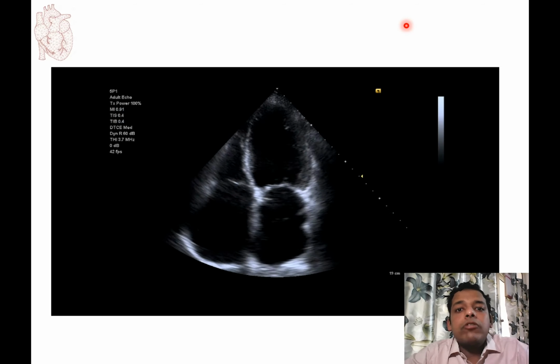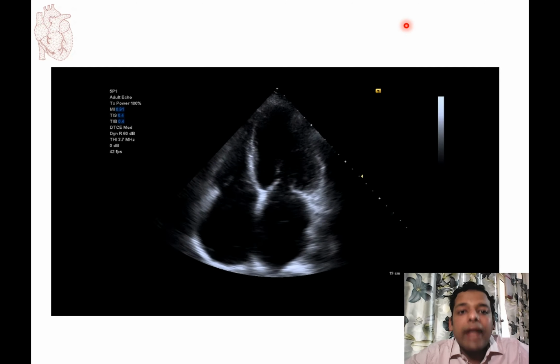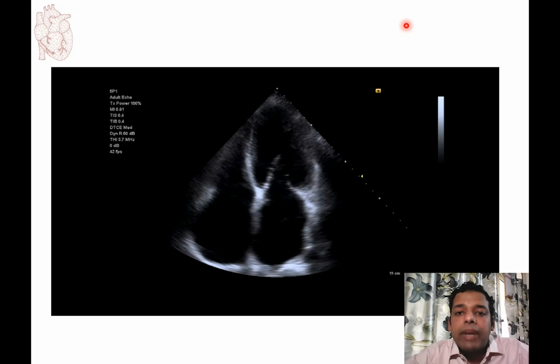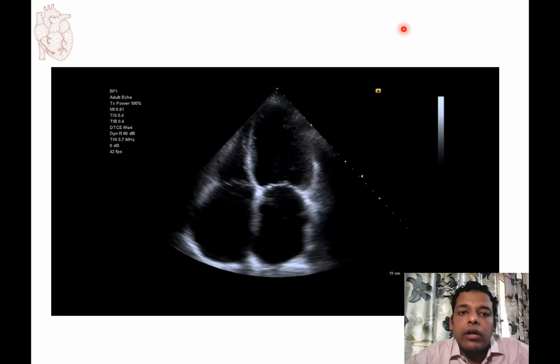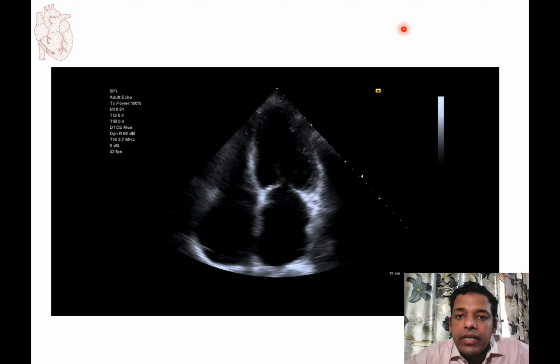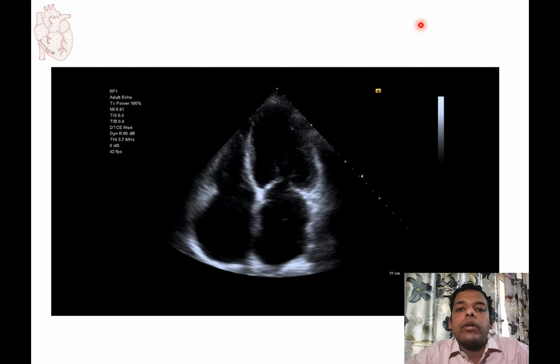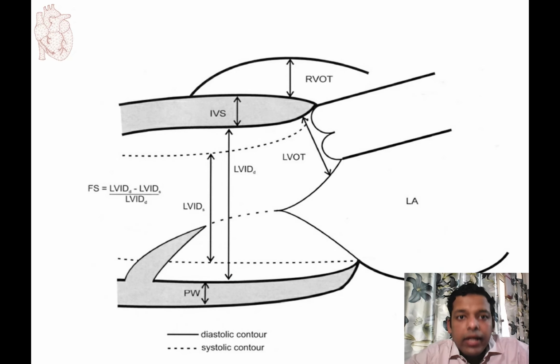The magnitude of opening of the mitral valve correlates with the volume and transmitral flow, and in the absence of any significant mitral regurgitation, it correlates directly with the left ventricular stroke volume. These qualitative assessment techniques are operator dependent, and the more you do, the more accurate you will become. The same features have also been standardized for quantitative measurements.